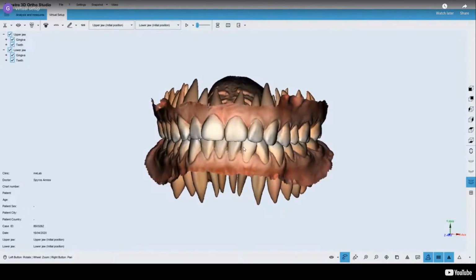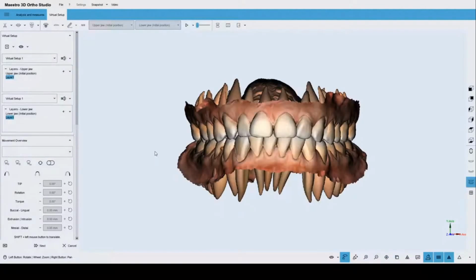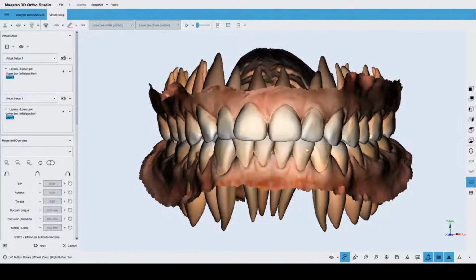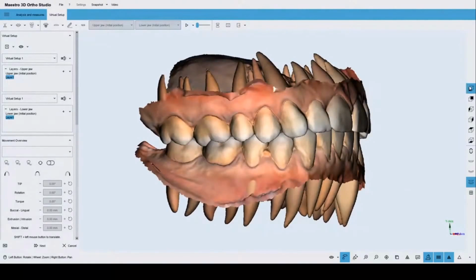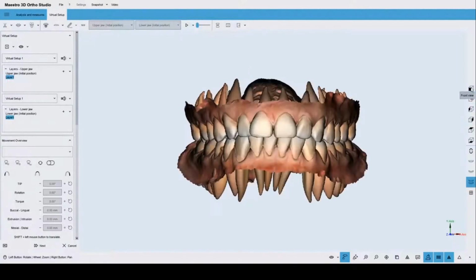I mean the step in which we can start to move the teeth in order to obtain the best smile for our customer. So, clicking on this icon, we can enter the virtual setup stage. You can see here in the main editing area the models. By default, you can see upper and lower simultaneously. You can move the models just by interacting with the mouse, or you can use the icons available on the right side of the screen to quickly change the point of view.